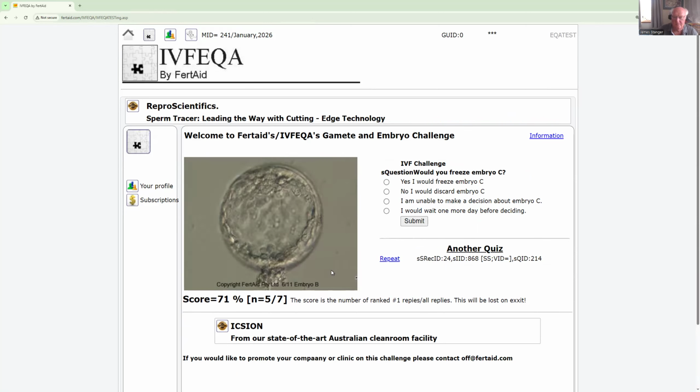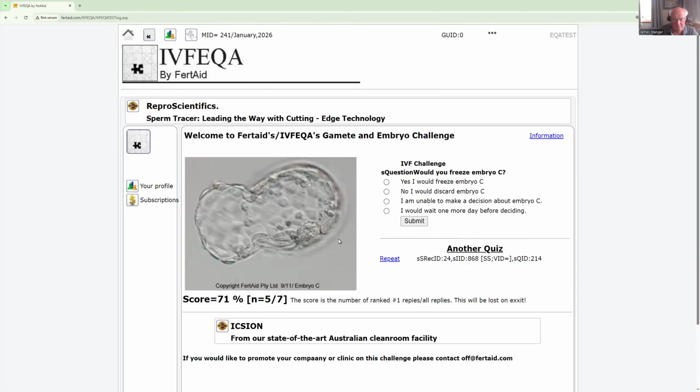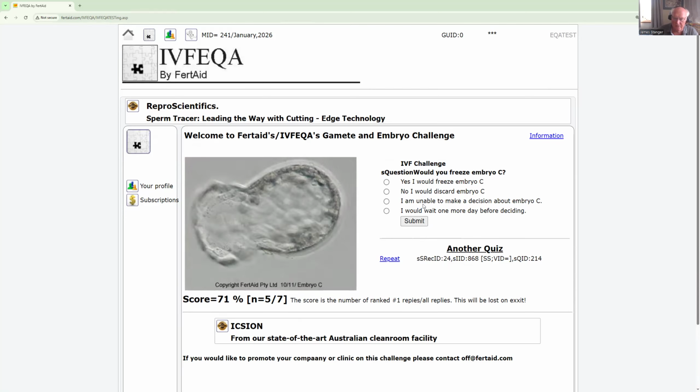B. So would you freeze? Incidentally, yes, I would freeze this one.